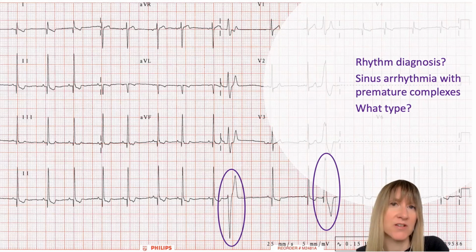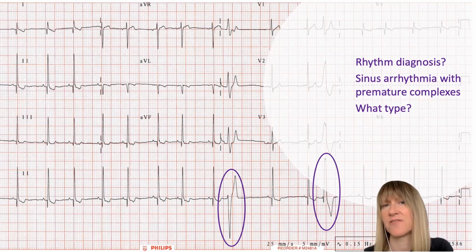You may recall from a previous episode, we talked about atrial premature complexes. And these ones on this particular ECG are unique in that they are wide and bizarre looking, so very different looking than the normal complexes. And that's really relevant, because that might share with us where they're originating from, and specifically the ventricles, because if they're arising from the supraventricular area, atrial or AV node area, they should look the same as the sinus complexes, more or less. But again, these look very, very different.